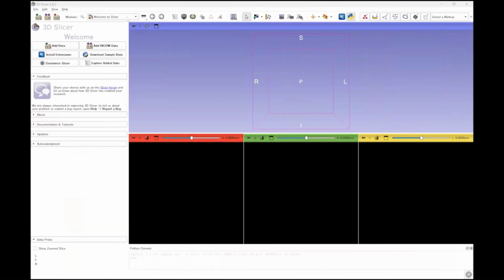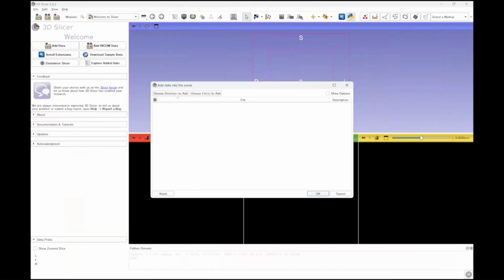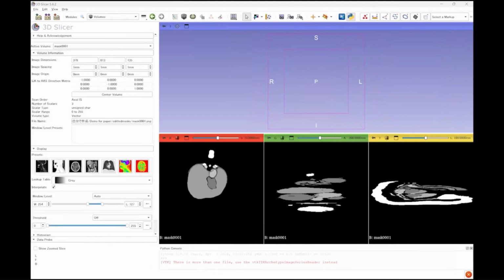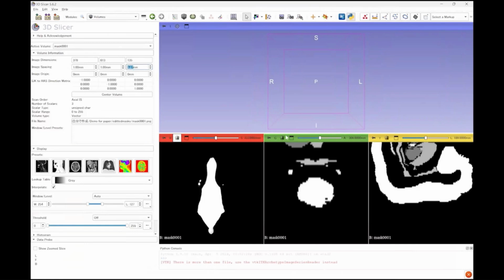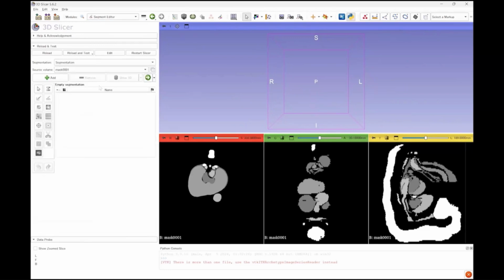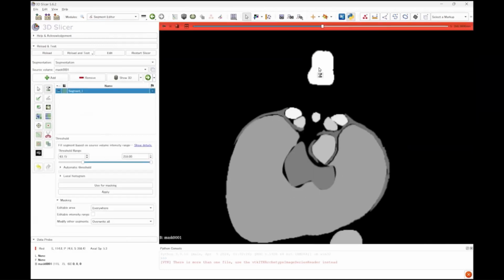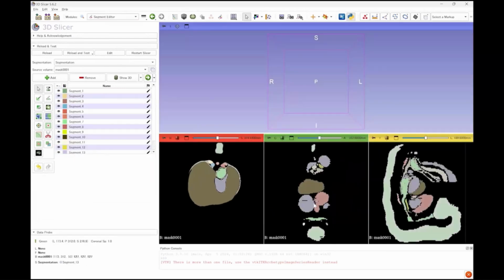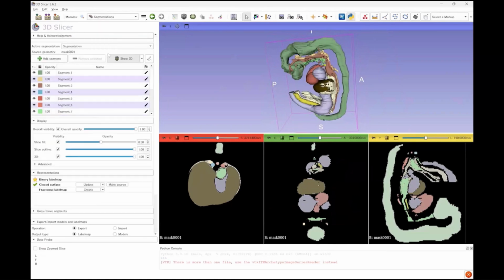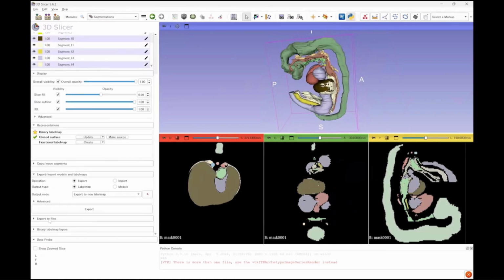You can import the segmentation data into software for 3D reconstruction, for example, 3D Slicer, and construct a 3D model. After entering numerical data such as the slice interval, a threshold value is set from the grayscale data to extract the segmentation area. Once this process is complete, the data can be converted to 3D data immediately. Finally, the 3D data can be output as general 3D polygon data, an STL file.